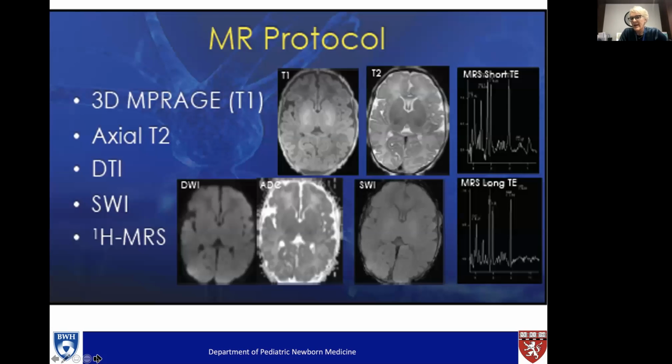So what does an MRI scanner produce? These are the types of images that you will see coming from an MRI scanner. You can see on the top line here, there is a so-called T1 and T2. And many times people get kind of torn up about these different initials and letters, and there's too many pictures and the MRI looks too complicated. So just remember, T1 and T2 is kind of like 1 and 2 when you're counting. These are the basics. These are the way to look at the structure of the brain, and they're in a way kind of inverse to each other.